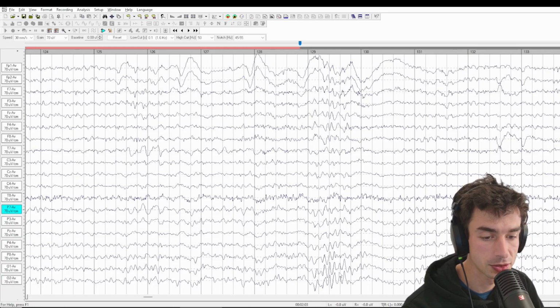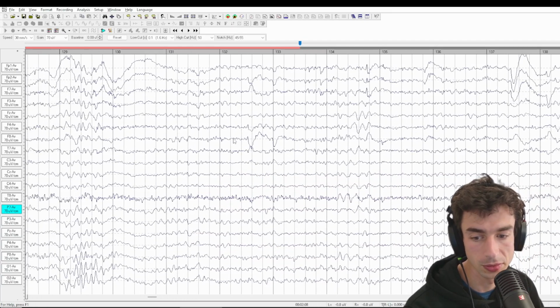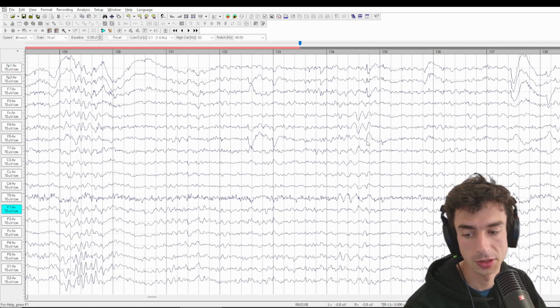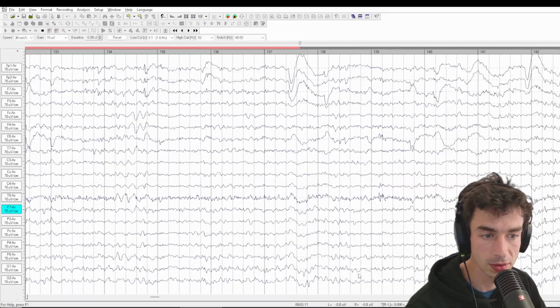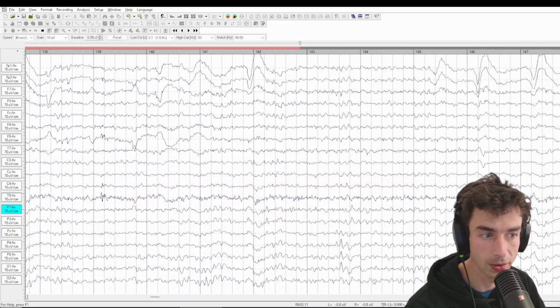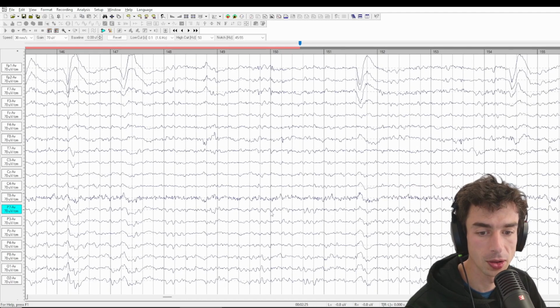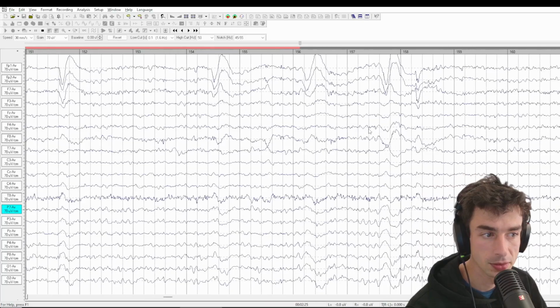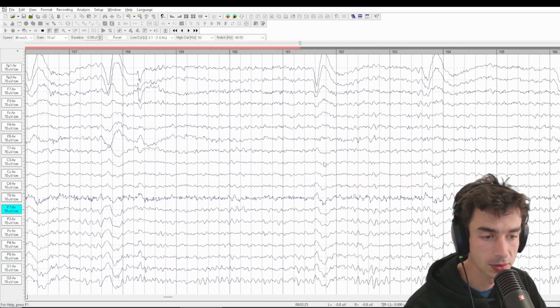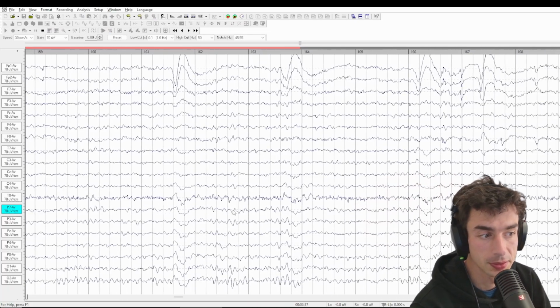Here we see an alpha resurgence after eye blink, really going through quite a few different states, shifting between this alpha dominance, the theta dominance, and then sort of a dropout of the background power. And look at how much smaller in amplitude this is than what we were just looking at. So even though the eyes are open, we're getting into sort of stage B sleep.